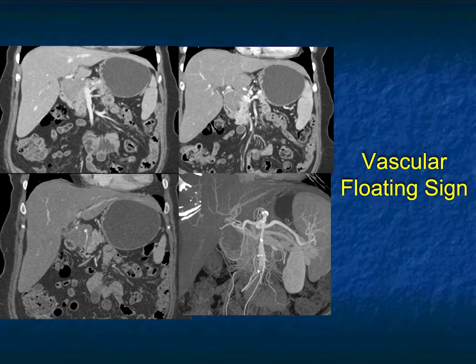What could be challenging here is you look at this and you say, what about pancreatic cancer? One thing that pushes you away or makes you think twice about pancreatic cancer being the diagnosis is the way the nodes or mass is settled. If this was pancreatic cancer, you would have had dilated intrahepatic ducts, which you don't see here.